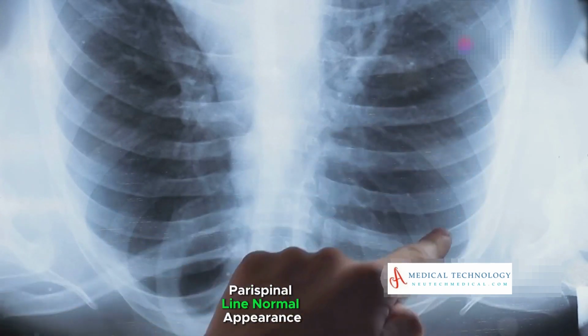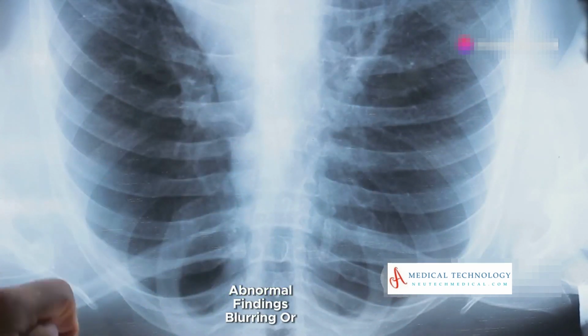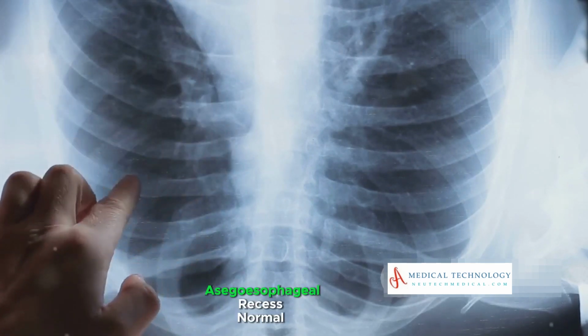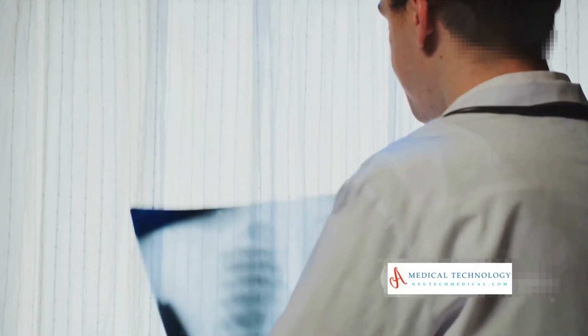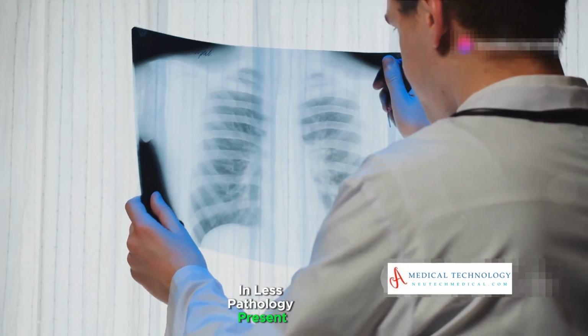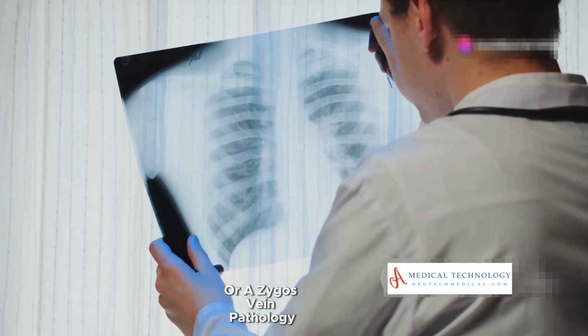Paraspinal line, normal appearance: thin, straight lines parallel to the spine. Abnormal findings: blurring or displacement indicates mass effect or vertebral disease. Azygoesophageal recess, normal appearance: small space, usually not prominently visible unless pathology is present. Abnormal findings: changes suggest esophageal or azygos vein pathology.